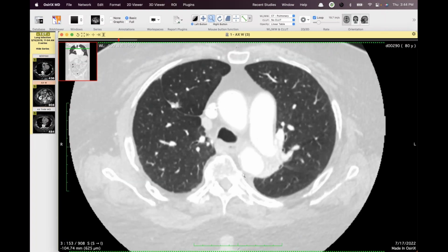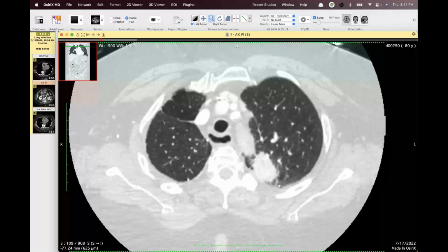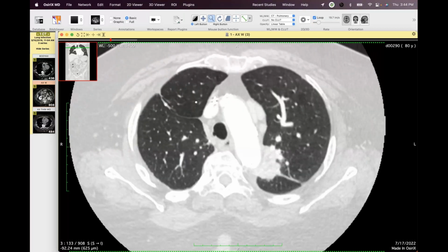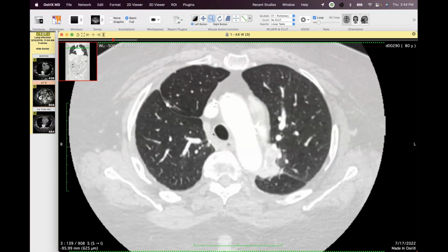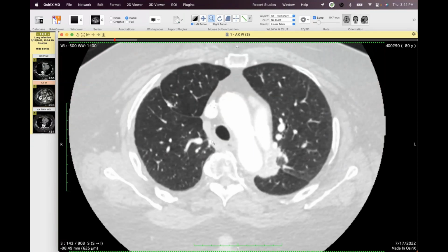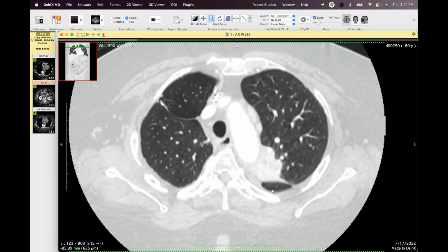And I think there's an aborted tracheal bronchus too, right there. It looks like there's a little one trying to come off on the right. He had a right upper lobectomy. Oh, this guy had a right upper lobectomy. Yeah, he may have had a little tracheal bronchus nub, and I couldn't get the previous. They had cancer in the right upper lobe, which is why they were getting followed and why they were worried about this.